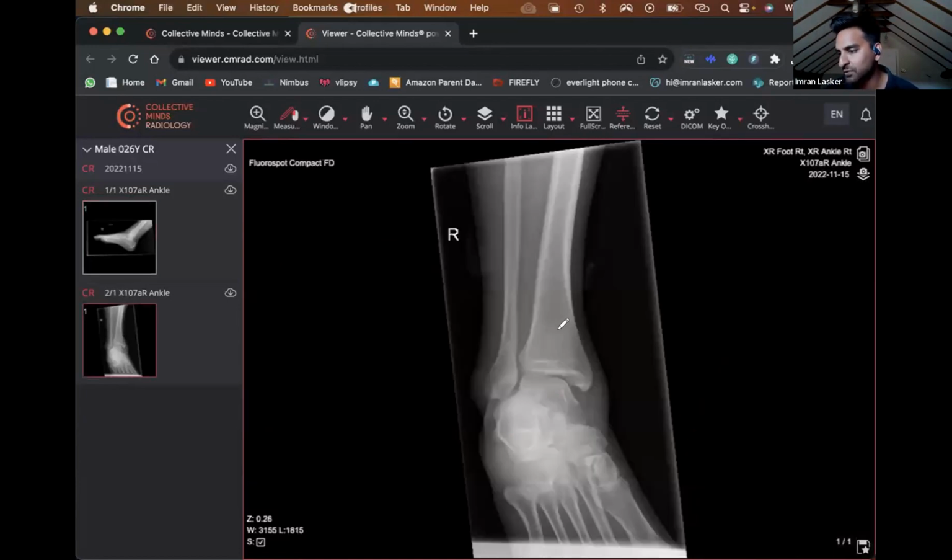Someone said about the syndesmosis. I don't think this is a great one to look for the syndesmosis, only because they're slightly rotated, so you might get a slightly oblique view of it. Main thing is that you look at all these check areas and then go for the obvious, right? Check area, then check area, then the obvious. That's the way to do the plain films, I think, because it's a second fracture that gets missed. It's the things that you didn't expect.